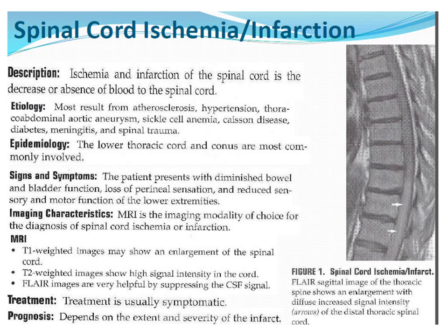They'll order an MRI for this. You'll see that there's no compromise of the central canal. There are no bulging discs, no spondylolisthesis, anything like that. You just see all this edema in the cord, with FLAIR imaging showing a T2 bright signal in the cord. That just indicates that the cord is inflamed. It's taking on fluid, and that happens whenever cells die from not getting enough blood supply.